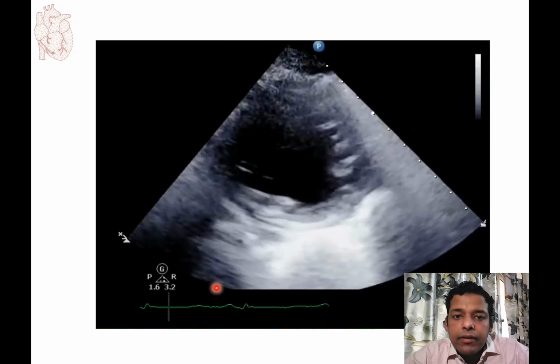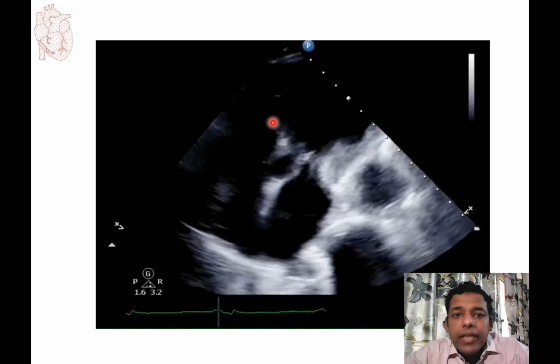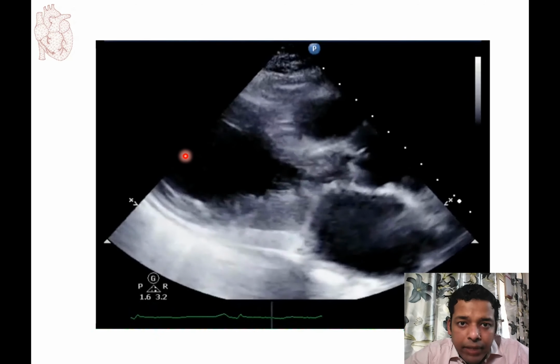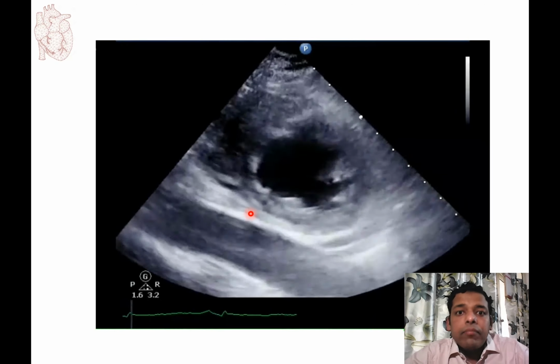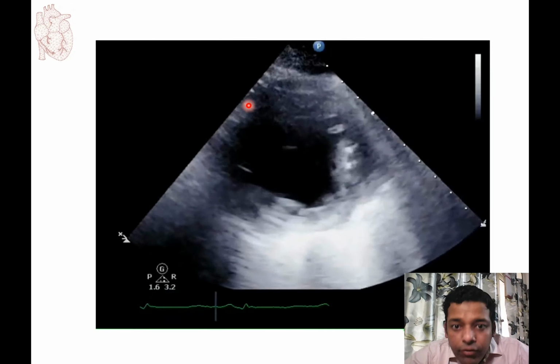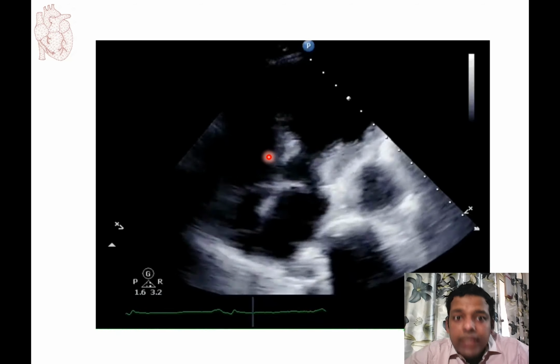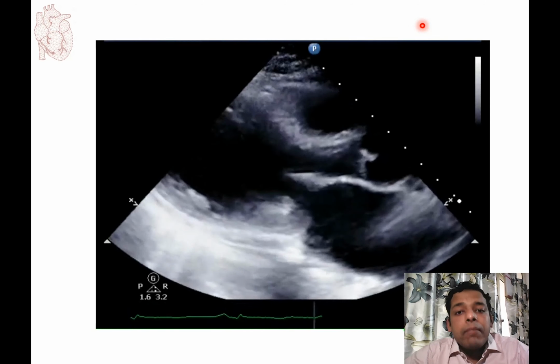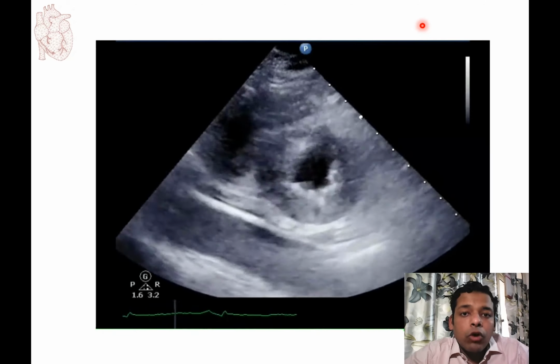Let us first see. Well, this echo reveals a marked dilation and ballooning of the left ventricular apical segment. Even though the septum and the anterior leaflet almost meet in the parasternal long axis view, this does not reflect a global left ventricular function. The basal septum is hyperdynamic here, so focusing only on the E-point septal separation data alone would give an erroneous impression of the overall function.